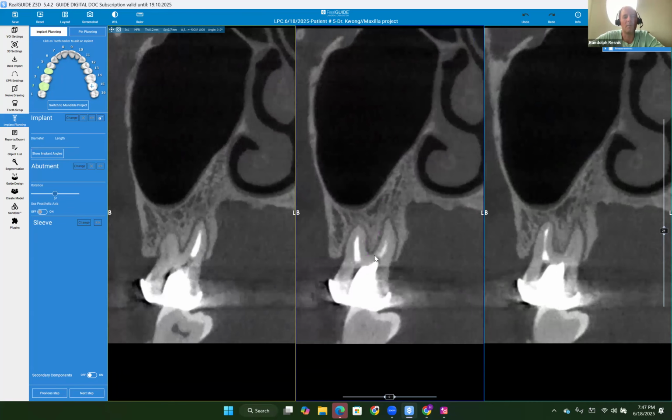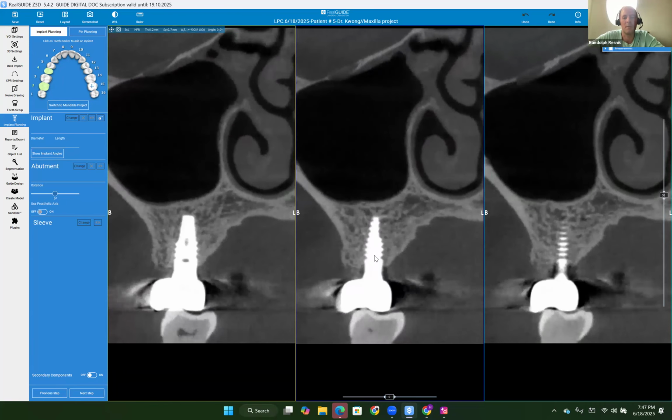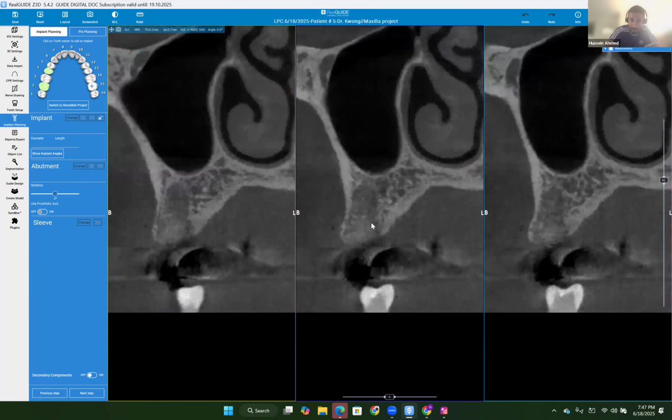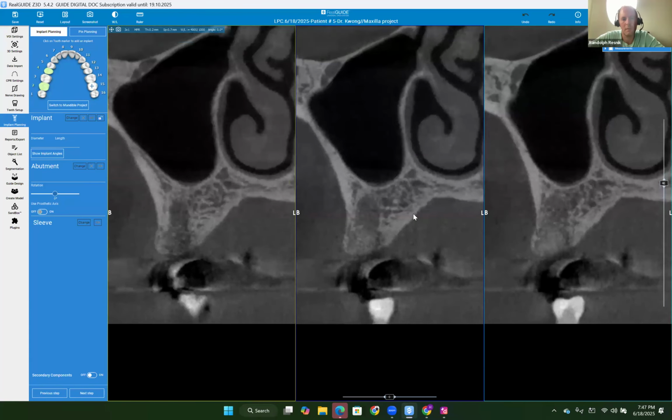Now, in terms of number 4 there, Hussein, let's go to that because that's been since October, so that's healed. The one thing worth mentioning, Dr. Resnick, at the site of number 4, sir, is that there is a demarcation line where I've got my cursor right now with the bone graft, and I'll leave it to you, sir.